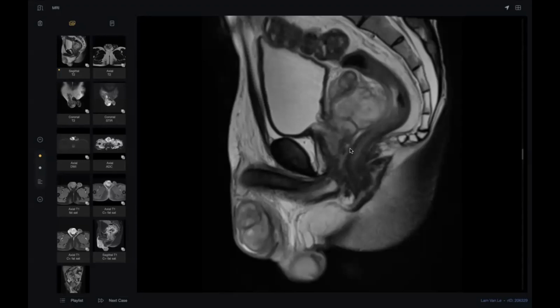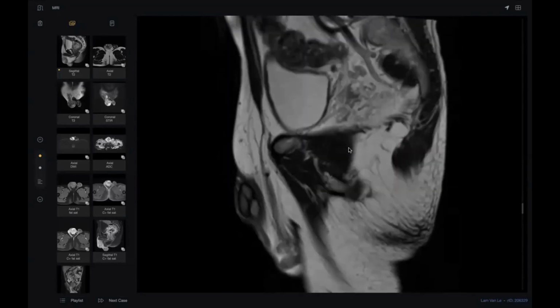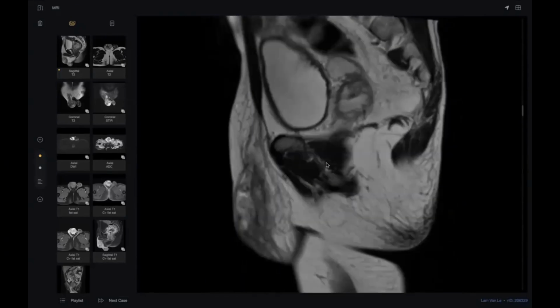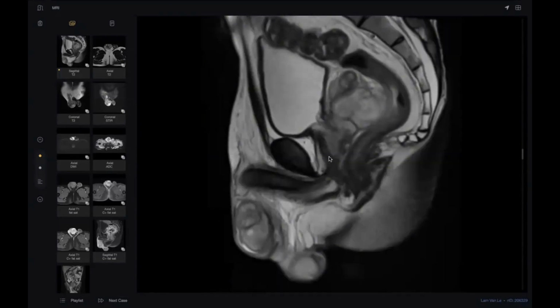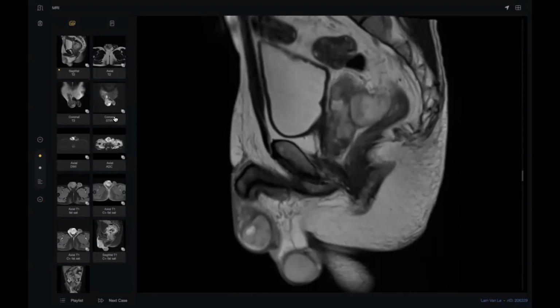Okay, so I just want to look at the prostate. I cannot see the prostate here. Yeah, it's very small. So I want to check the same area in the axial images because the previous axial images were only at the scrotal region. Which one is axial post contrast?